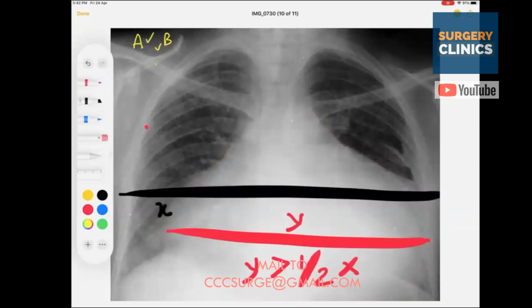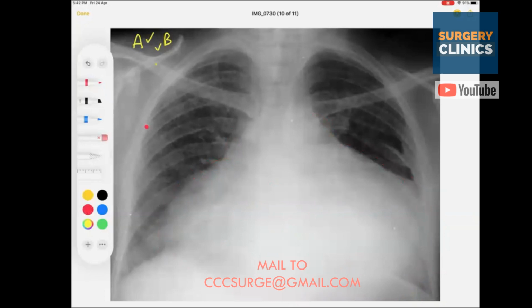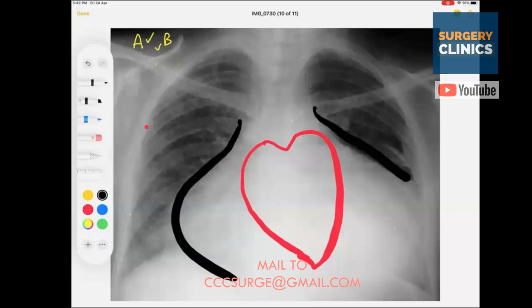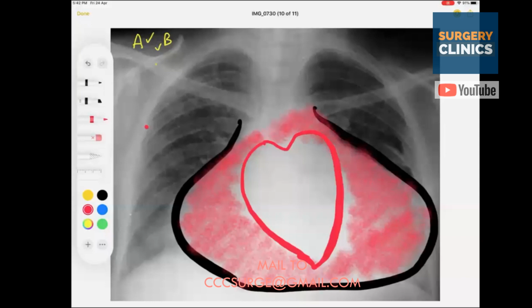That simply means after the kick that he received in his chest, very simply means that his heart may have been here, but surrounding the heart, there is a big cavity, and that cavity is now filled up with a condition called pericardial tamponade. So remember, it is pericardial tamponade. So let me write it out for you.